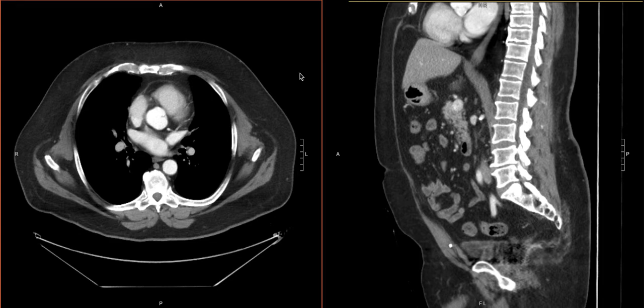But I think it's very important to kind of make sure you hone in on the areas that give you the most pathology first. And then you kind of alternate between what you're looking at as you're scanning down the abdomen and then up the abdomen, so you are efficient. But that's kind of the initial looking at the soft tissues.